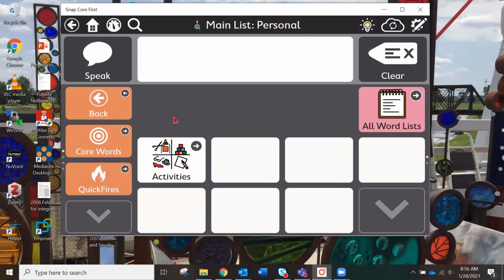So after we've done that specific activity where I've really focused in, maybe for eye gaze to make sure someone can really look at and see that key, or making sure someone who's doing touch access orients to the screen, visually looks at it, and doesn't have as much visual clutter initially to learn that there is a new key there, I'm ready to bring these keys back.